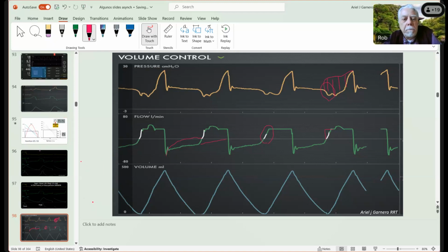Yeah, and something to remark is that the inspiratory effort, the extra flow, is only delivered on a certain part of the flow. We can observe that it's not working very well because we can see this degree of flow shifting, and there is no extra flow happening here. It only happens during this initial part, which makes me question the comfort this patient is having at this time, although this mode is designed to provide extra flow. Yeah, at any rate, those little efforts aren't very big, so I don't know that the patient would even notice that they're being uncomfortable, but it's hard to say.